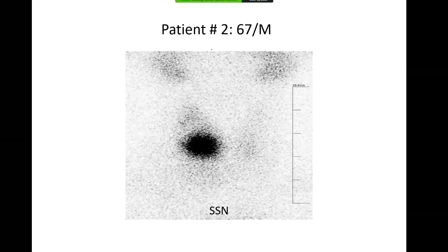So remember that one of the rules in thyroid endocrinology is if you have a patient who is clinically or biochemically hyperthyroid, the chances of malignancy are very low in those patients. So this would not be a malignancy, very unlikely. So in a setting of hyperthyroidism, a nodule showing increased uptake, as you said, this is a hot nodule. So what would be your diagnosis then? This is a functioning thyroid nodule.